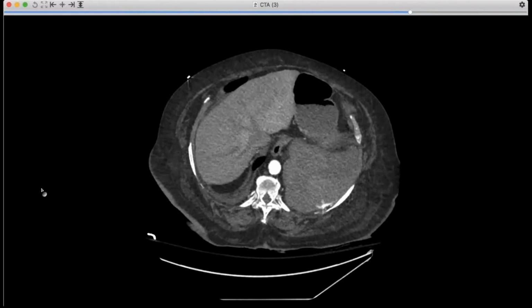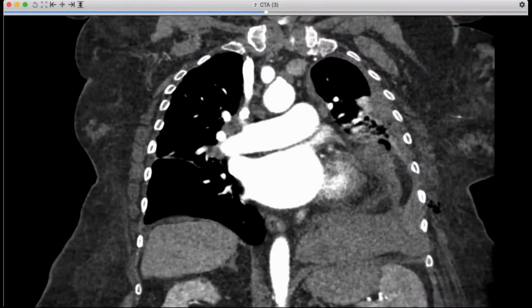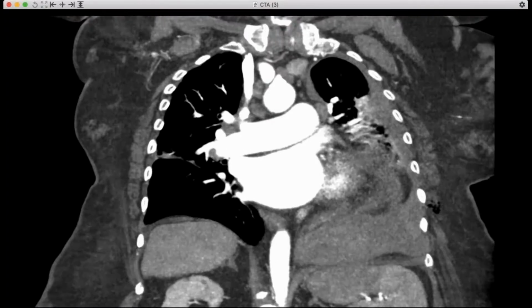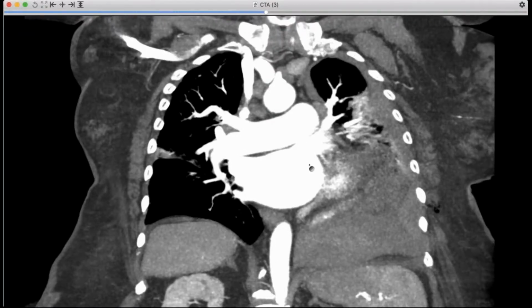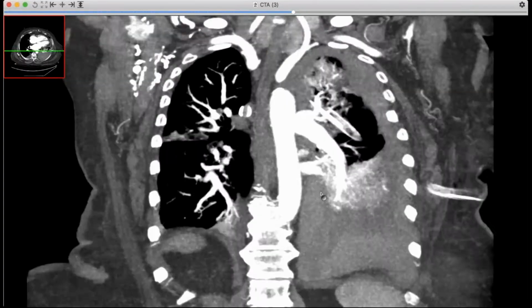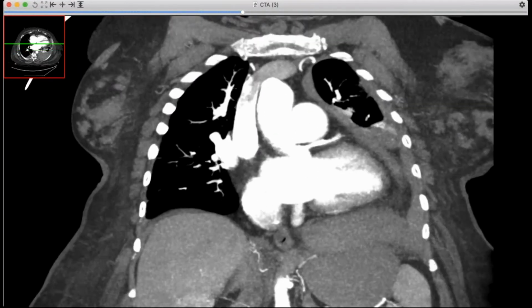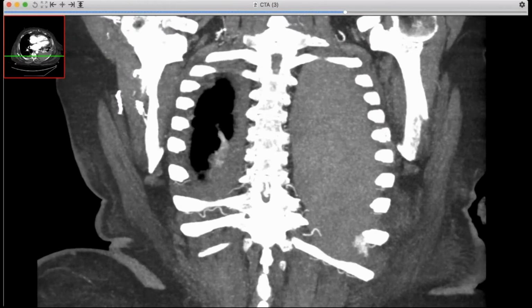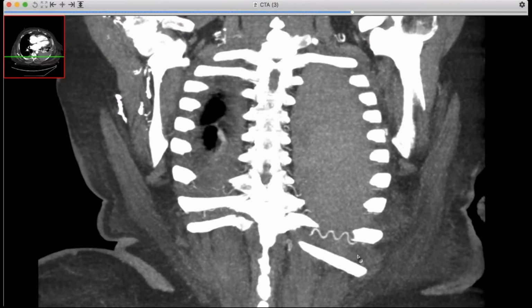Now, I think the other important teaching point for some of the more experienced people is that we learn, when we do thoracenteses or lung biopsies or even back in anatomy, that the intercostal arteries typically live in the groove underneath the rib. But as you get older, those arteries become more tortuous, especially if you have patients with systemic hypertension. And you can see, this was the artery in question.